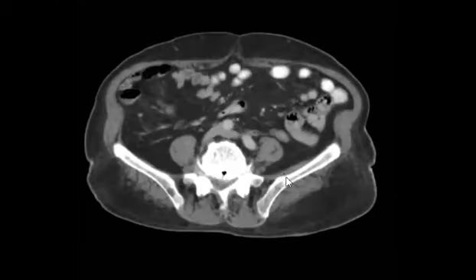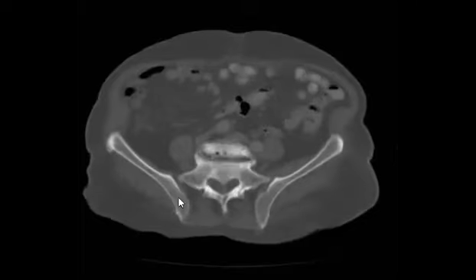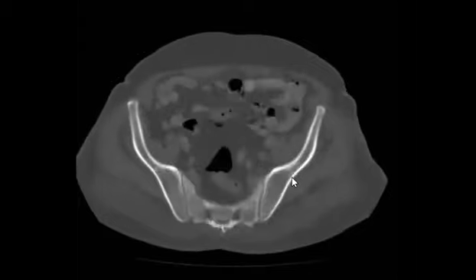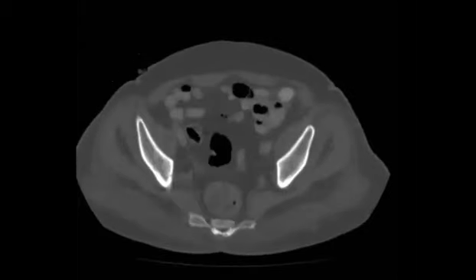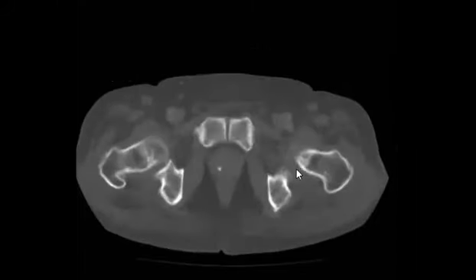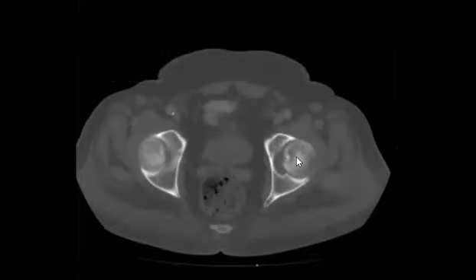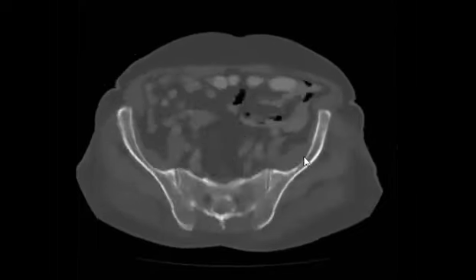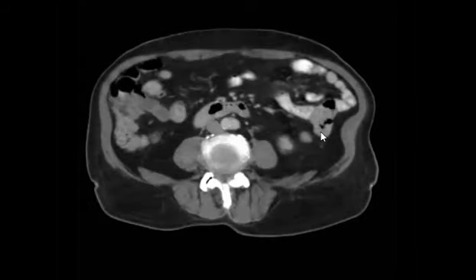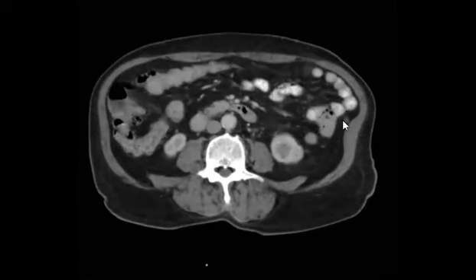Let's go to the bone, and I see that some of you caught that there are some lytic areas in the bone, and I think Ala already mentioned it. So I think the big star tonight will be Ala. Thank you. But you missed something, but okay, this is your first time, so we agree with you. Also it is a quick scroll, so it's not like you scrolled it for that. Also, you can find something here.